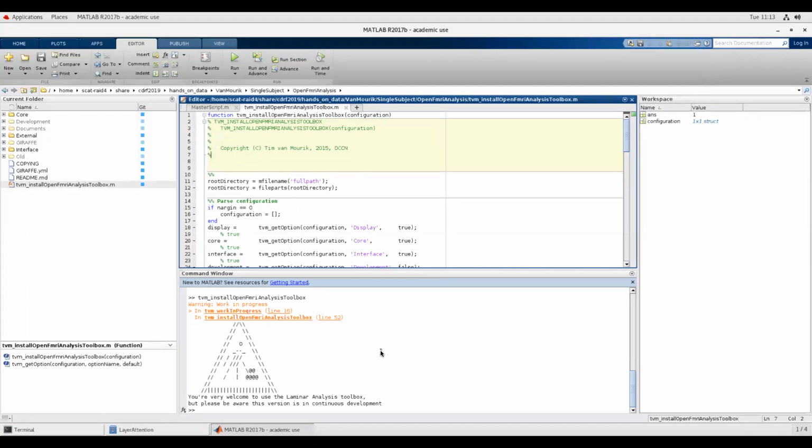I see some puzzled faces. Sorry, where did you install? You open this file and we're figuring out the name. That's right. You can just open it. You can also just run it from anywhere. But running that file takes care of the path settings. Literally it's just path settings. It adds the path without you having to figure out which path to add. That's all.